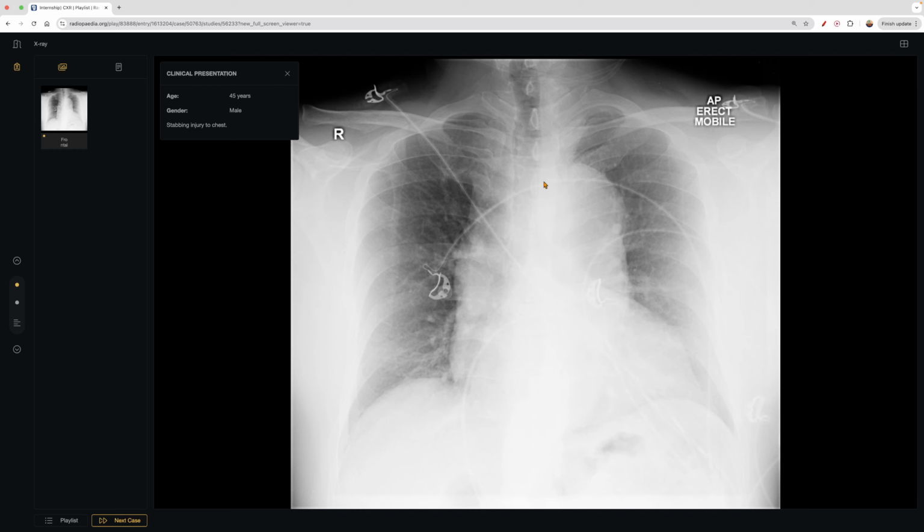And then we come back up here and it's like, whoa, this mediastinum is a bit widened, right? Normally it's not as wide like this. And so what we see here is that something here is super bulgy, super big, right? And what tends to lie here, we talked about earlier, is the aortic knob or just the thoracic aorta as it becomes ascending to descending, right? And so the differential for this is fairly limited, being an aortic dissection, a thoracic aortic aneurysm perhaps, or some other neoplastic process just causing a huge mass.